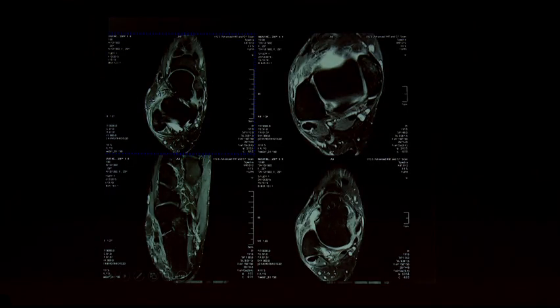Here, all ligaments have gone for injury. This is anterior tibiofibular. You can see the partial rupture, and you can see the calcaneofibular ligament has gone. The low signal is not seen between peroneal tendon and calcaneum, and you can see the anterior talofibular rupture. So anterior talofibular, anterior tibiofibular, calcaneofibular. It is high as well as low ankle ligamental injuries. Lateral complex have gone. So we have studied lateral ligaments.